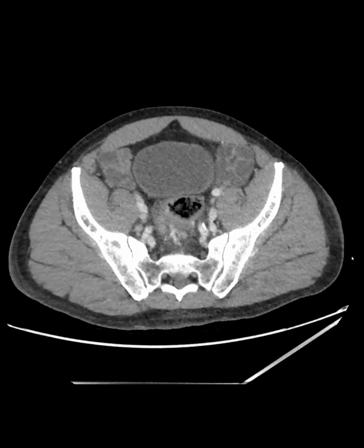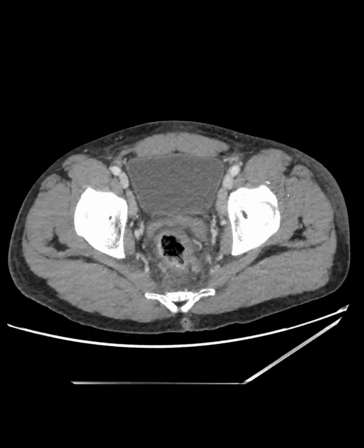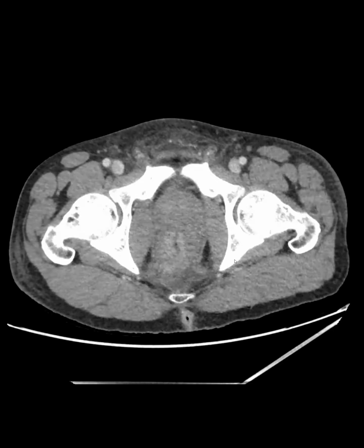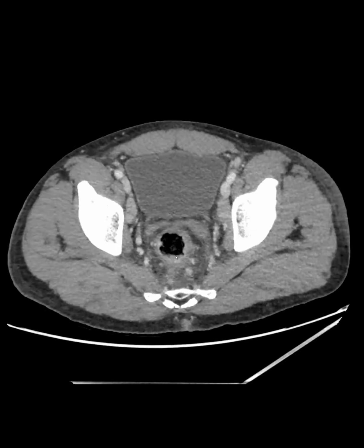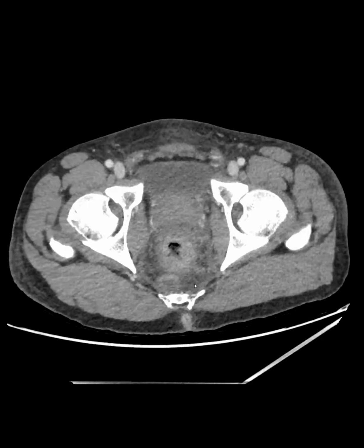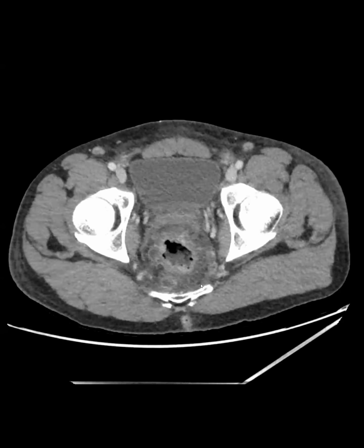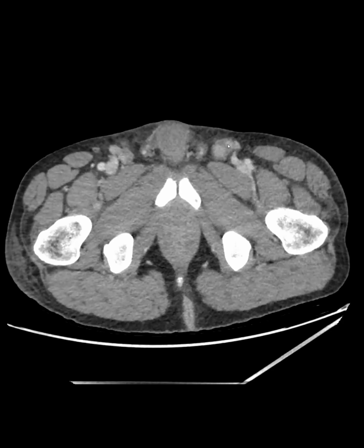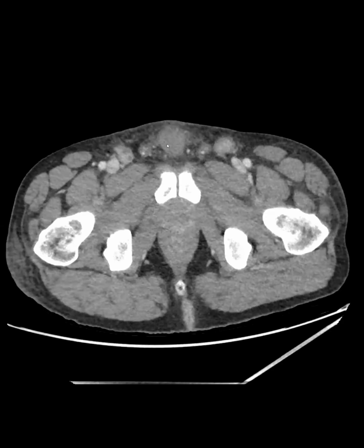Any thoughts? So there's rectal wall thickening, and I think AIDS patients get solitary rectal ulcer syndrome. Good thought. So severe wall thickening, hyperenhancement, a lot of fat stranding, engorgement of the vascular vessels going all the way down. And then there's also some lymph nodes.